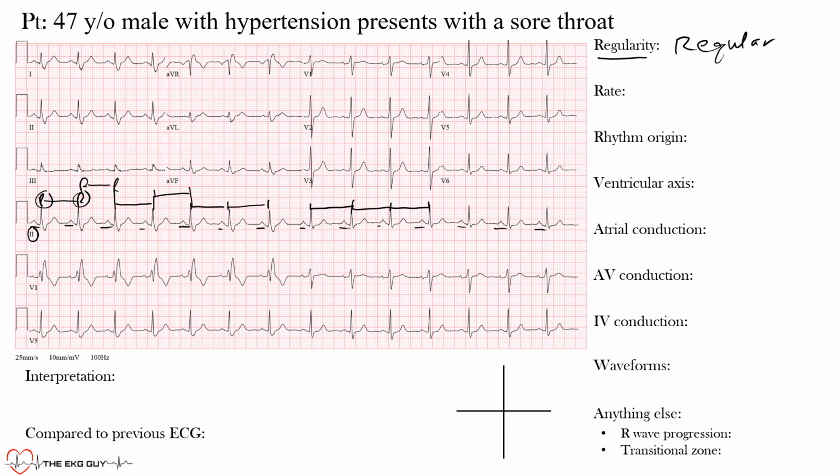You may notice already that some of those beats that come in the beginning here look different from those that come afterwards, maybe more clearly in this lead. So notice that they're different. That's one thing to keep in mind. We'll get to that in a little bit. So this is a regular rhythm.